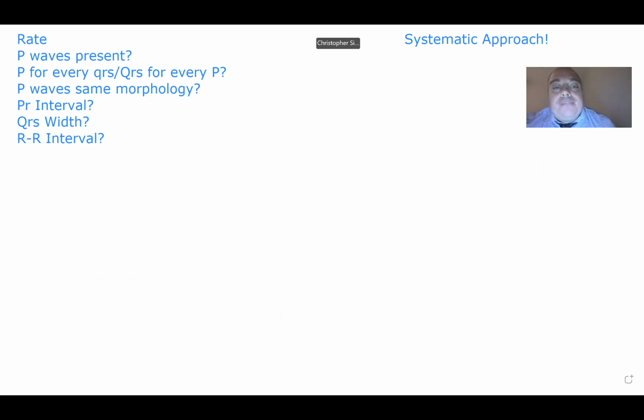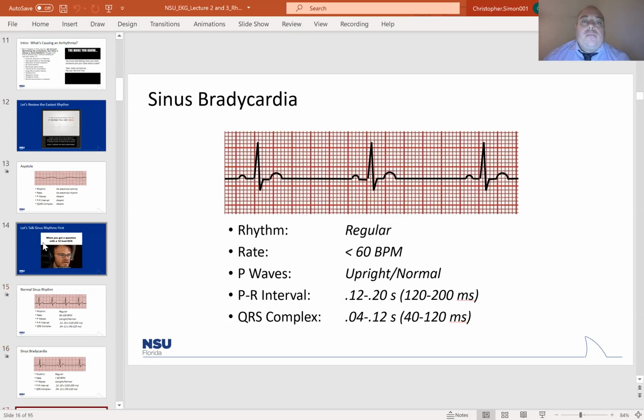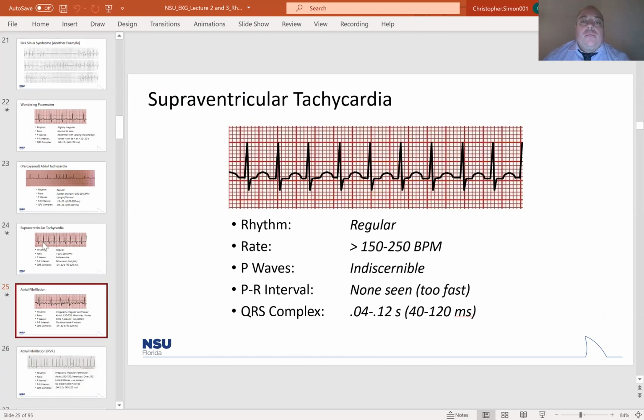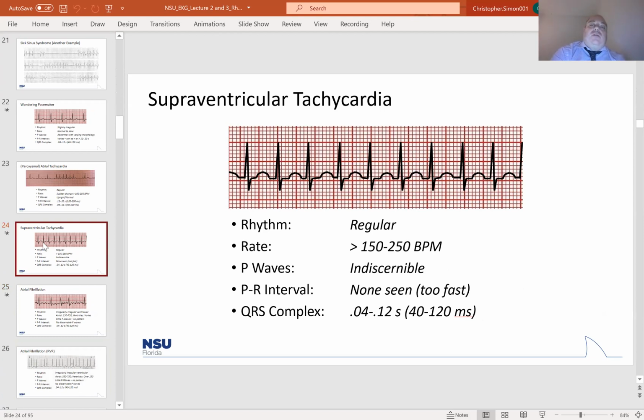Okay. So let's find some atrial stuff. So let's talk for right now. So let's look at supraventricular tachycardia, okay? So I'm just going to use this for example right now. It's just a little bit easier than drawing it out, but we can always draw on the screen.